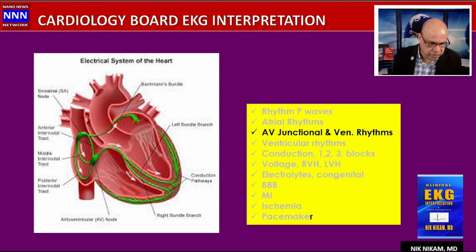So we are not concerned about the connections from the sinus node to the AV node, nor are we concerned about the bundle branches like the right or the left bundle branches. Mainly it is connected to the AV node and sometimes the His bundle, but we don't need to worry about the His bundle because there's no mention of it on the EKG key. So we're going to be focusing on AV junctional rhythm, and the ventricular rhythms can be accounted for by the PVCs or the couplets or triplets or trigeminy arising either from the right or the left ventricle.